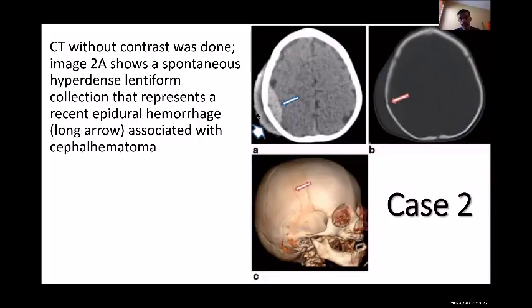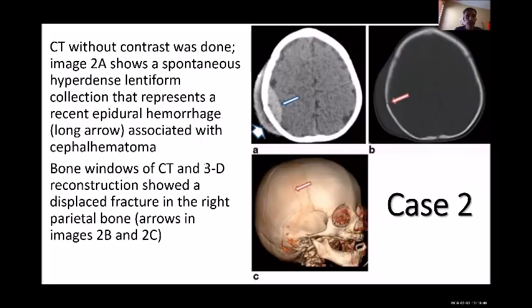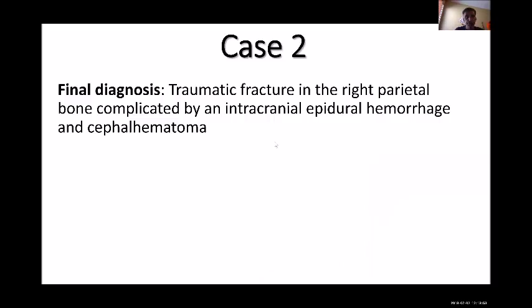Again, there is extra swelling. I'm not sure whether it's a cephalhematoma or subgaleal. It's hard to know without a clinical exam, because there is a limitation, and I don't know whether it is just not progressing or it's a real suture limitation. But it looks extra-axial, and there is lentiform swelling here, and there is a fracture. So this is the diagnosis.